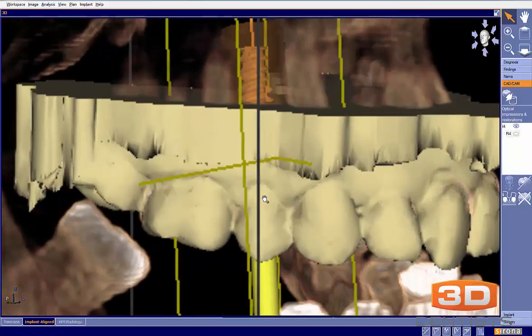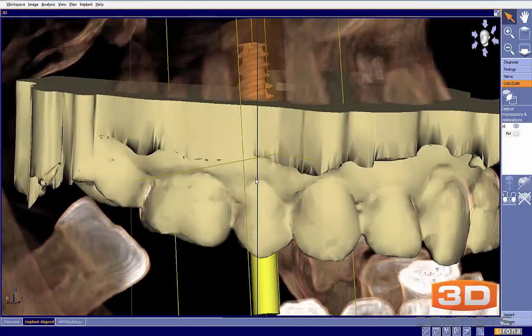We know that there's going to be approximately 1 millimeter of tissue loss here. So in this particular case, what I like to see here is my existing gingival margin, let's say. And then we know that on average, after extraction, we're probably going to lose about 1 millimeter of tissue from the trauma of the extraction itself.